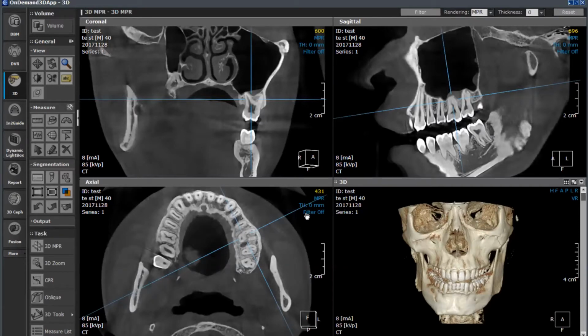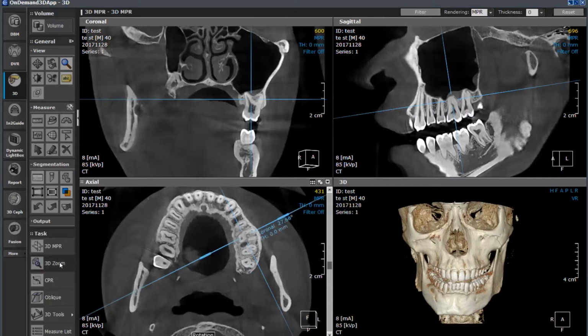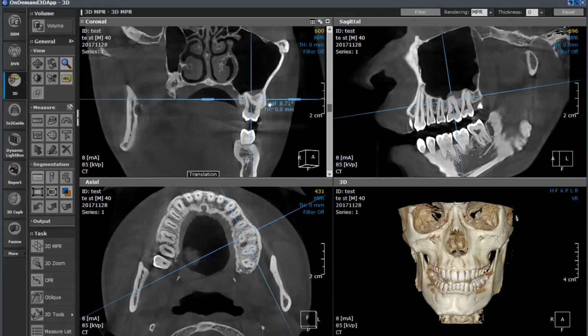But again, this also gives you the ability to create those tangential planes all along the maxilla and mandible, so you can evaluate more than just the tooth that you're looking at as well. So in this case, we know that this one has 4 roots, so we can actually go through there and find a number of ways in which we can take a look at it. So if we were going to do an endodontic procedure, we already kind of have an idea that this may have a curve to it, but let's go ahead and kind of break it apart a little bit.